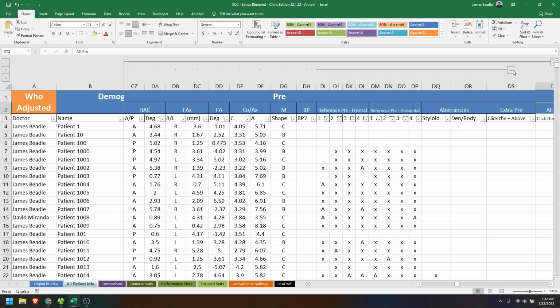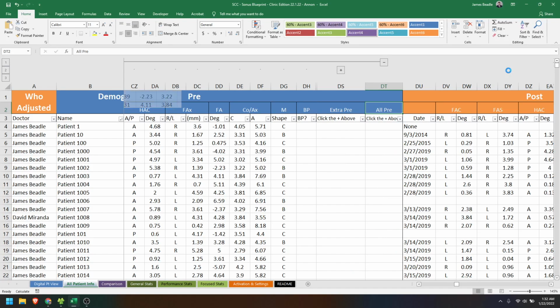Well, instead of hiding it, I now have it to where it's a grouping, so you can automatically hide it like this as needed or as wanted. So preferably you fill out everything. That's what everyone should be doing. But that's not what everyone is doing. So I'm not going to force you to change your habits. That's fine. You guys do what you want to do. But at least now you are aware that it exists instead of just hiding it and forgetting it. Now you'll see this plus symbol to remind you.